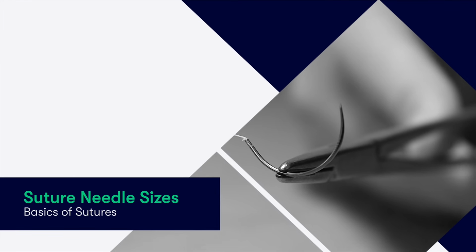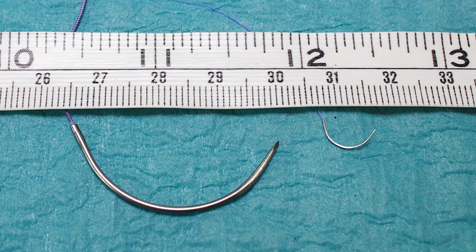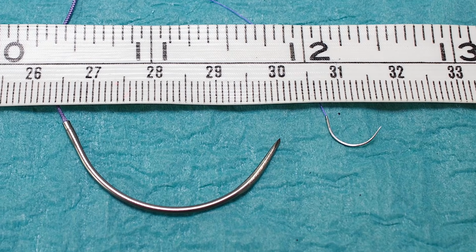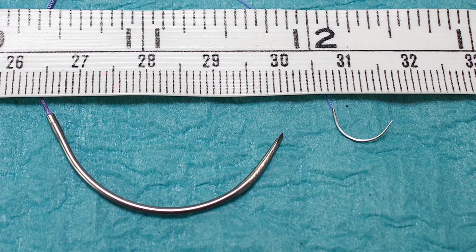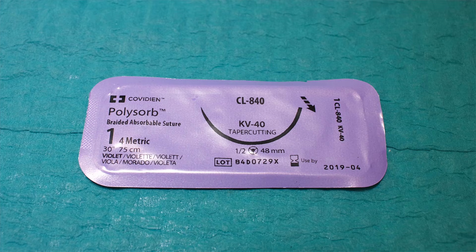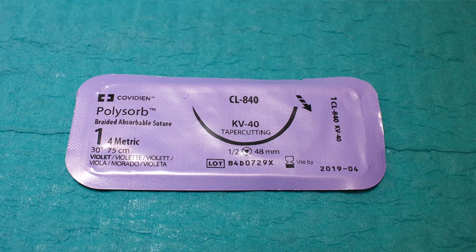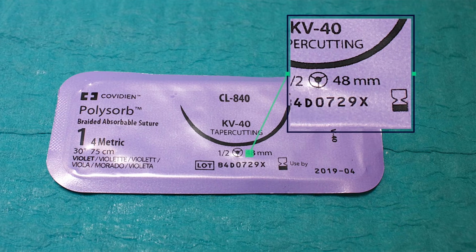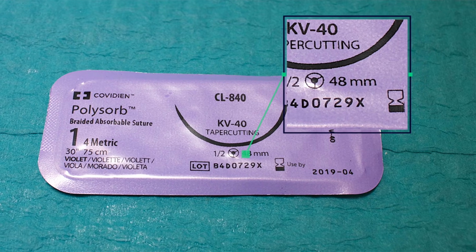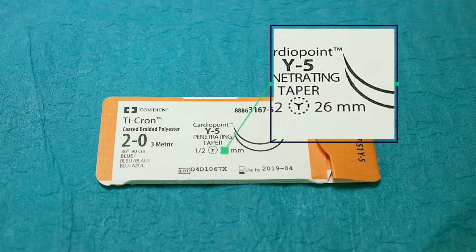Suture needles can be of varying shapes and sizes. Here we can see a large needle that is attached to a thick 1/0 suture, and for comparison, a relatively tiny needle that's attached to a 5/0 suture thread. As you'd expect, typically, the thicker the suture thread, the larger the needle, and vice versa. But if you want to check the size of the needle, it's displayed upon the packaging, as you can see here. So the needle inside here is 48 mm in length, whereas this needle is 26 mm.